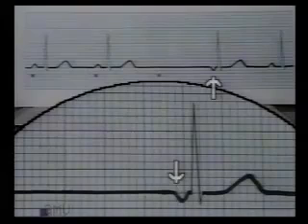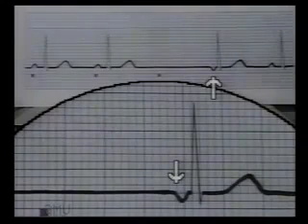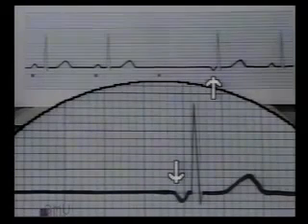This ECG shows a pause with a preceding normal sinus beat and normal T wave. The escape beat shows an inverted P wave very close to the QRS complex, which has normal configuration. So this is a nodal or junctional escape beat. A nodal escape beat may also show absent P wave. It occurs after a pause of 1.2 to 1.6 seconds.